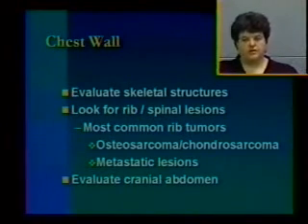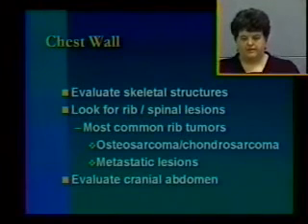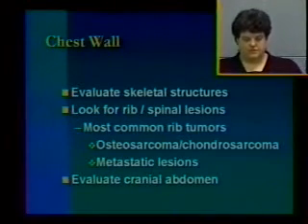And then finally, you don't want to forget to evaluate the cranial abdomen, because you may get a hint that there's some abdominal disease going on and that you need to further evaluate the abdomen with radiographs or ultrasound.